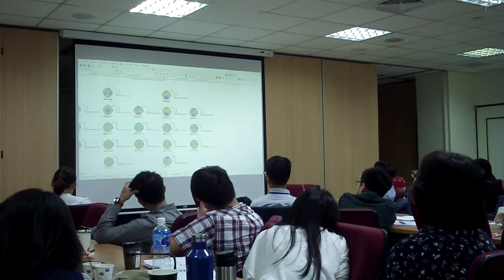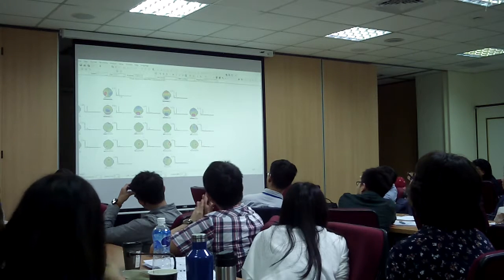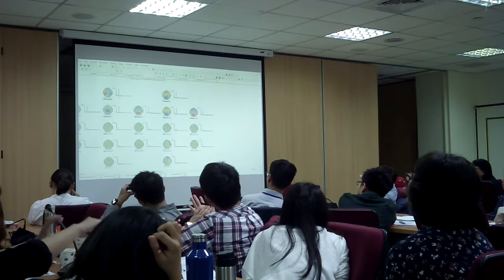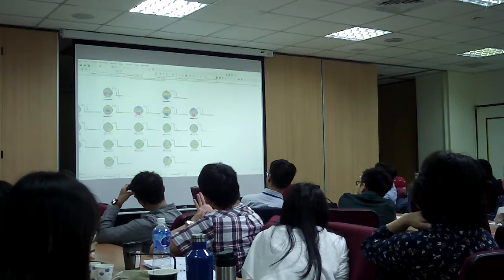And I'm going to go to this one, and again, look at the boxes below here. If I click here, you're going to see the range is about 10 hertz. So it's slow and fast alpha, right? Sorry, going too fast here. About 9 hertz.